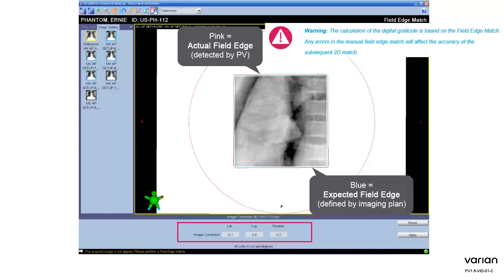Warning: the calculation of the digital graticule is based on the field edge match. Any errors in the manual field edge match will affect the accuracy of the subsequent 2D match. Click Apply now to accept the correction.